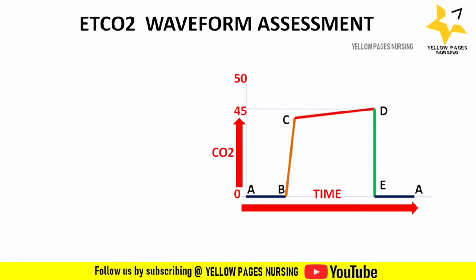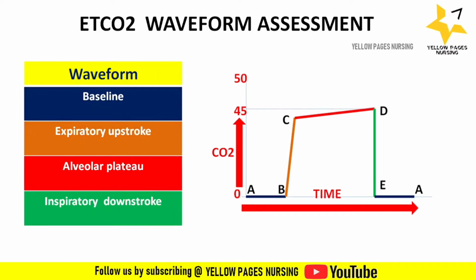Next comes the end tidal carbon dioxide waveform assessment. When you look into the monitor, the following components are very important to assess if the waveform is normal or abnormal: waveform, baseline, expiratory upstroke, alveolar plateau, inspiratory downstroke.